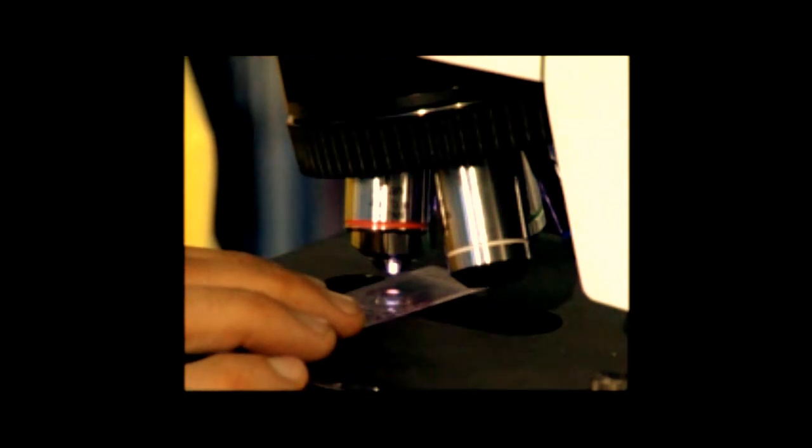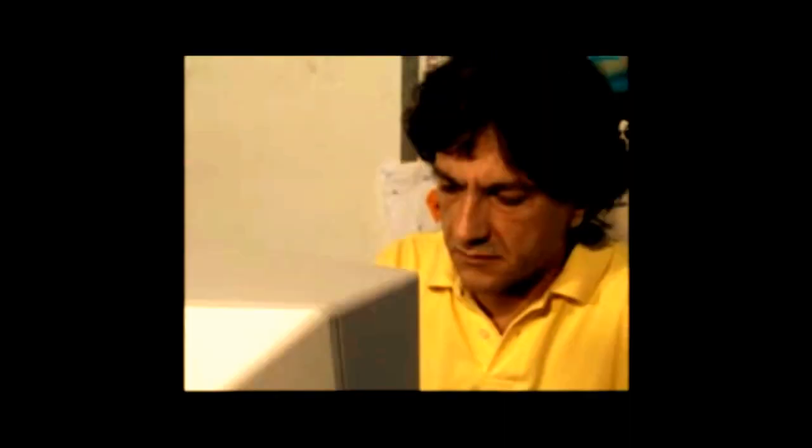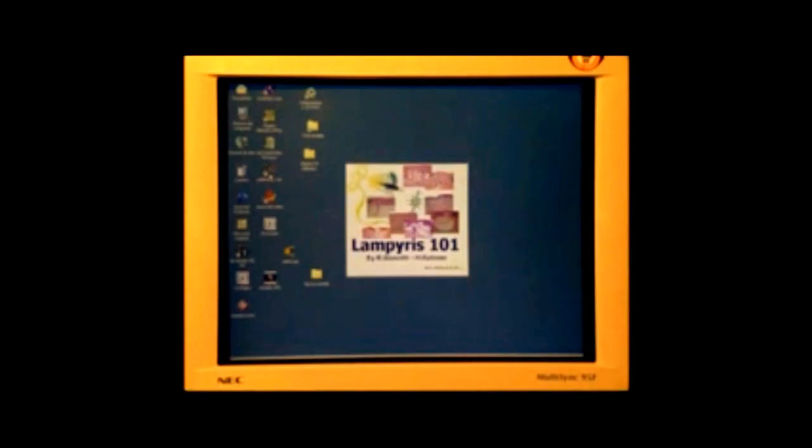The system uses a schematic algorithmic pattern approach because it is the best and logical basis for a computer to file and retrieve all necessary information about inflammatory skin disorders. In fact, Lampyris works with a few basic patterns that again contain various sub-patterns which in turn comprise different diseases.